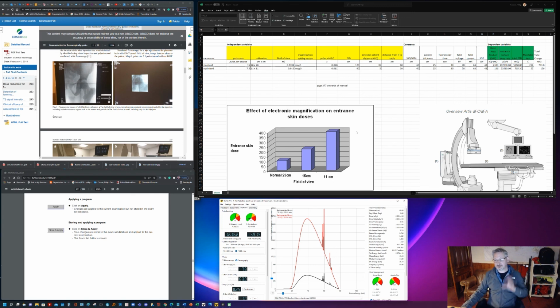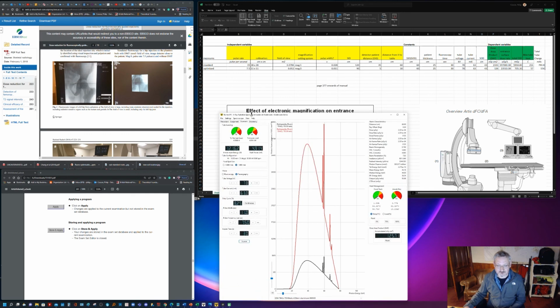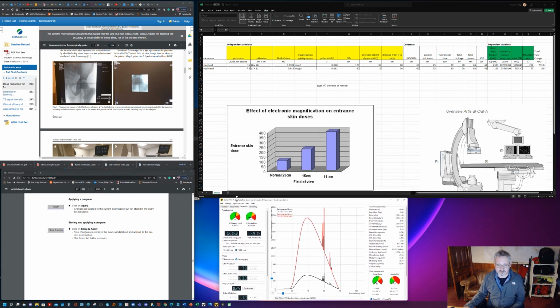So there you go. That's how to do a little experiment to prove the point of the paper and to create your own data using TechnicVR as the simulation. And of course you get this visible difference in the dose burden for the patient between those two situations.